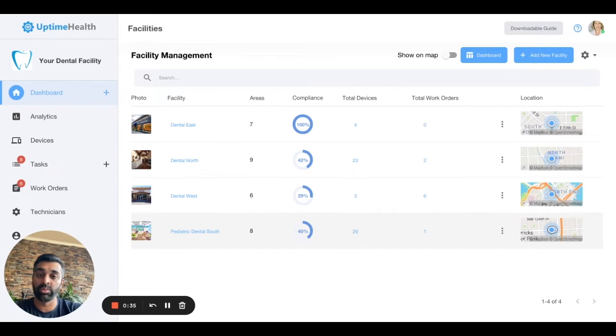The biggest goal is we want you to be very comfortable with how your operations are doing and are they following the direction that you set out to them. If something's not at 100%, that usually means that there is a task that they didn't complete, and you can drill into that very quickly just by clicking here.